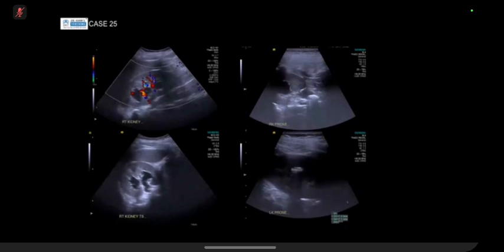Yeah. I'm sorry, my terrible left kidney image has tricked you. This is just lots of shadowing from ribs and not getting a great image of the left kidney. There's no dilatation on the left. Sorry, it tricked you a little bit. But the right side, you're completely correct.